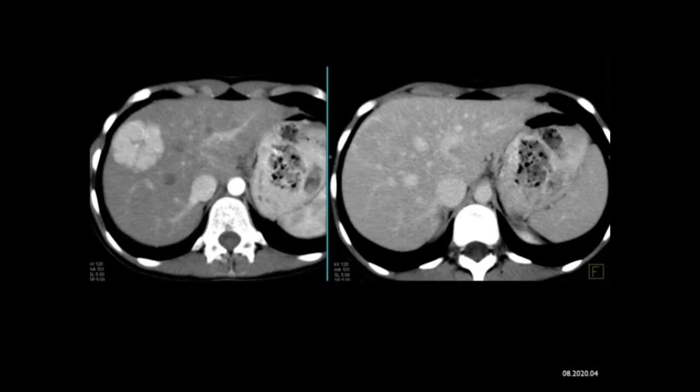When you look at the arterial phase, in addition to the homogeneous enhancement, it enhances like the IVC in terms of brightness, not the aorta. There's also a central scar. And yes, I know central scars can be seen with hemangiomas or even hepatomas, but the classic lesion, vascular as bright as the IVC, central scar, quickly becomes isodense, is very classic for focal nodular hyperplasia.